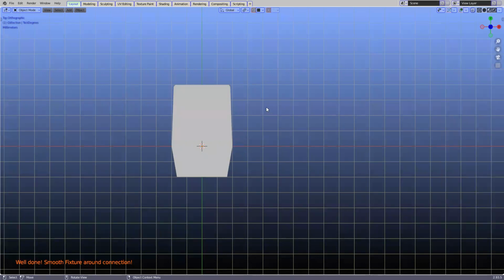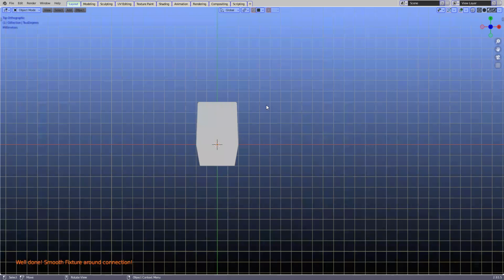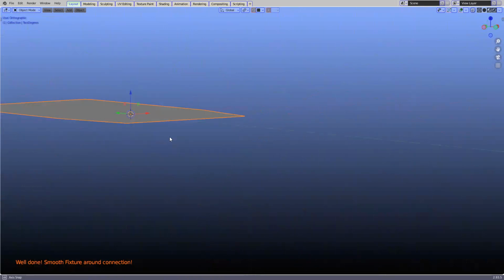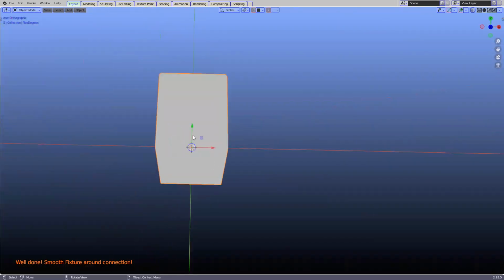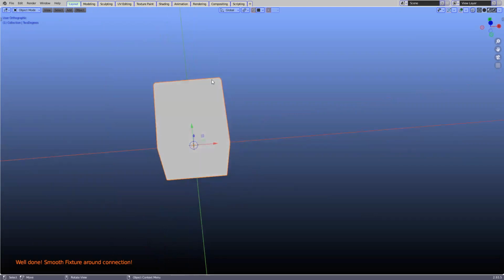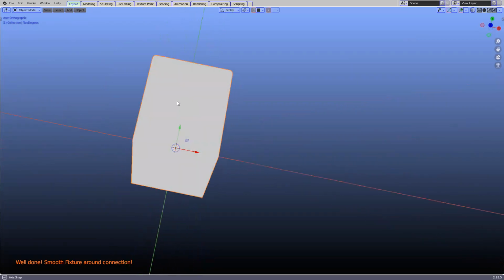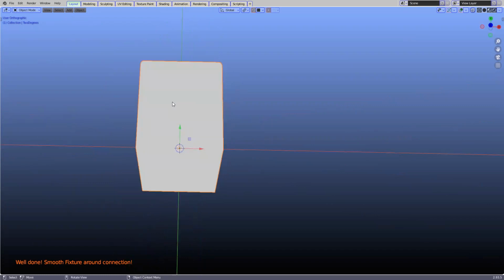Excellent. So what we are seeing here is just a basic shape. It's a flat piece, and this is part of the bar module, and anyone can design their own flat plane. Now, some of you who know Blender probably know exactly where I'm going with this. This is very powerful because it allows you to design your own shapes.